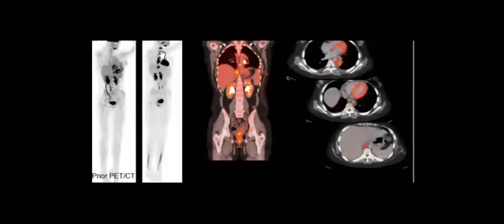So what is newly developed here? After 4 months, there is new soft tissue. So where is the position here? Paravertebral. Perfect. So retrocrural or paravertebral soft tissue.